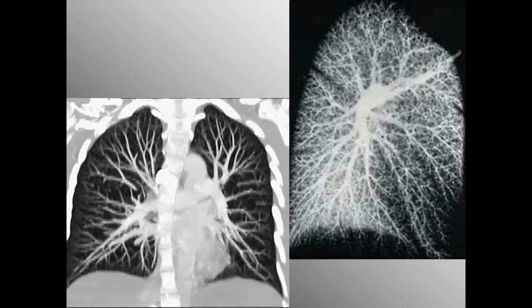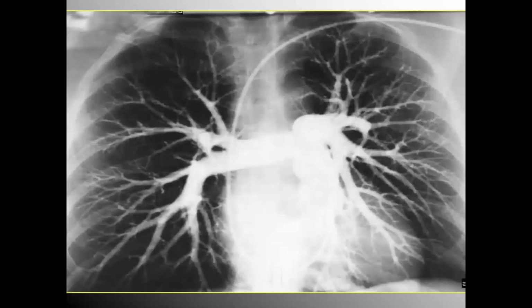But nevertheless, bottom left, you're looking at vascular markings. Upper right, you're looking at airways. They look very similar. It's because they trace the same path. And that's just a free clinical nugget, even though it's just a chest X-ray talk today. Here's a patient that has a pulmonary arterial catheter inserted with contrast dye, being administered probably to make the prominent arteries more prominent. And you've got tapering great vessels of the hilum, which you can easily see.